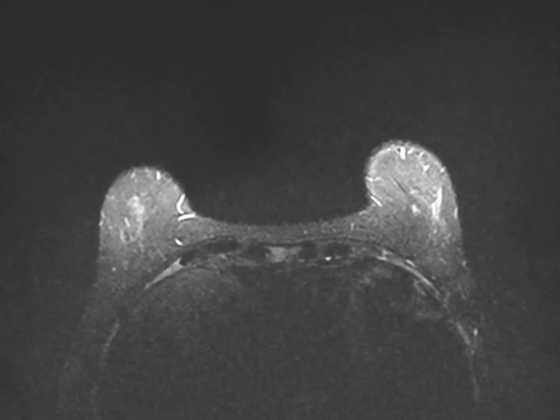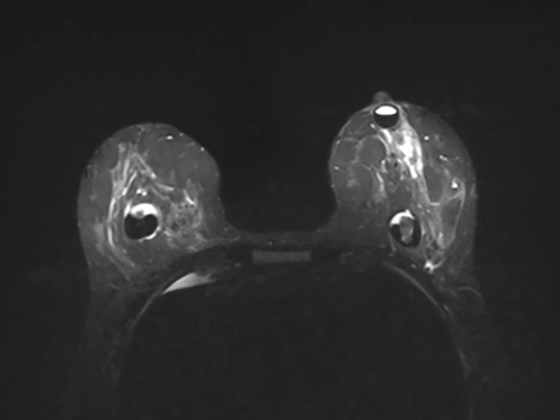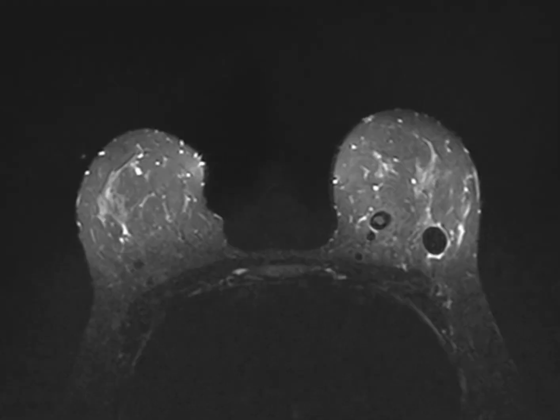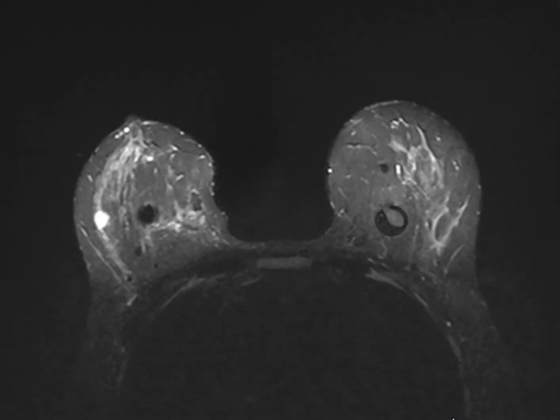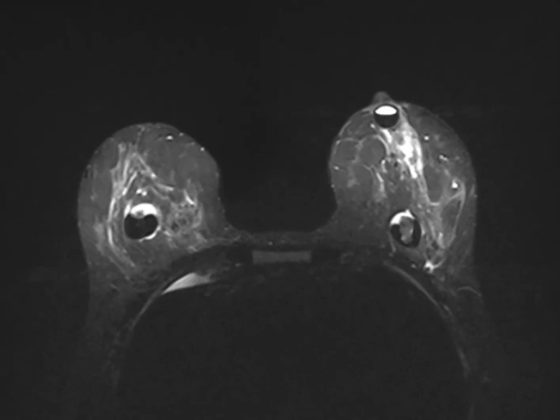We will start with this very interesting case of a 38-year-old female patient with a strong family history of breast cancer and abnormal ultrasound findings, referred for breast MRI to exclude possible carcinoma. She has no previous history of any intervention in the breast, no implants, and she's healthy, just to exclude underlying breast carcinoma.